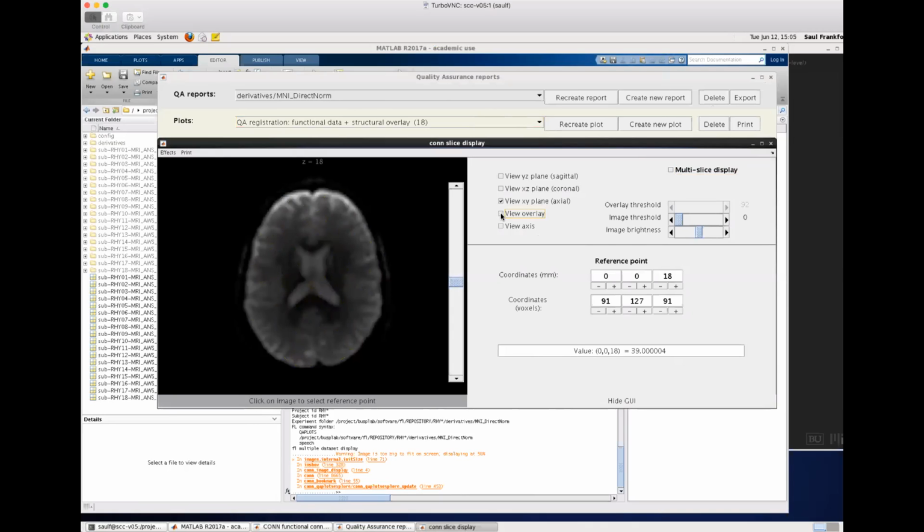Yes. When there's something like this, it's kind of hard to see up there, but there are some deeper sulci areas that, when you add the overlay, I guess it is covered actually. Oh, never mind. You chose a bad example. I know. Well, maybe it's not a problem.